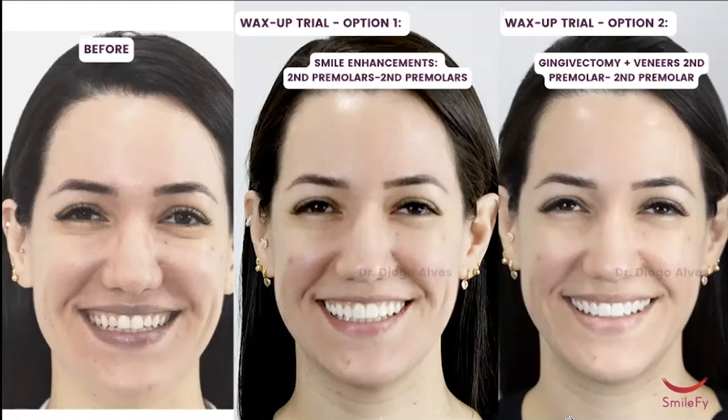Then to light cure it, finalize it and create the silicone key, another 40 minutes. So in total, from the 3D design part, it took us about an hour and 30 minutes to go from calibrating the files up until having the silicone keys. Then a second appointment took about 30 minutes, in which the patient was able to visualize both options.